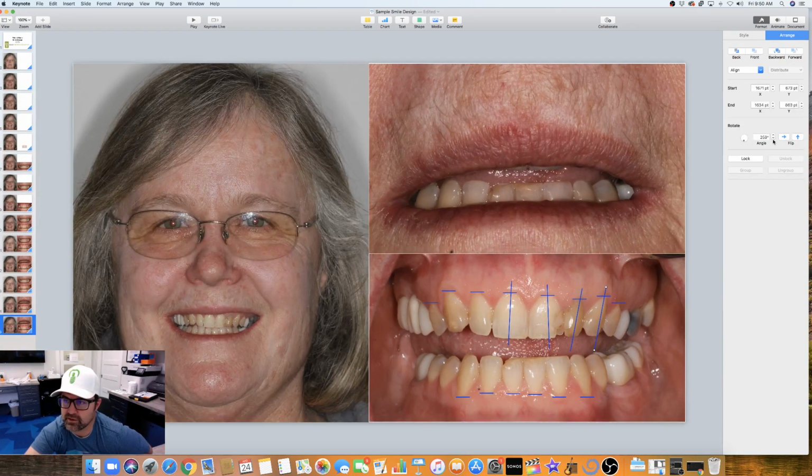And again, that one looks like it is also more inclined. So maybe not that much. Let's move it over there. We just keep doing this until we feel that we have shown the existing inclination of each tooth more visibly. Come back over to this side now. There we go.